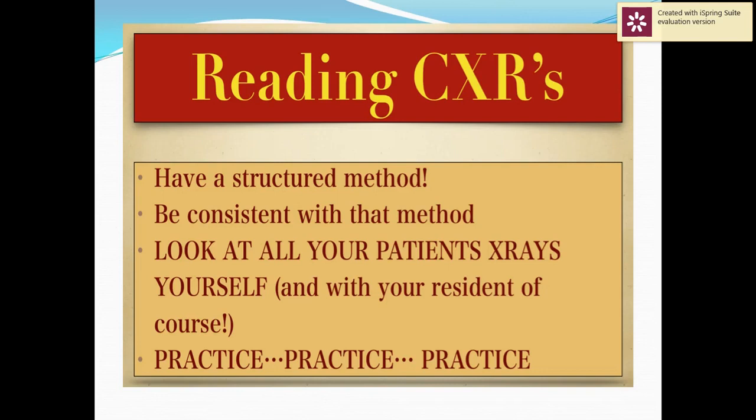Reading chest X-ray طبعا لازم يكون أي طبيب يكون عنده structured method ويكون consistent with that method. كل X-ray لازم يبدأ فيها ويكون consistent with that.